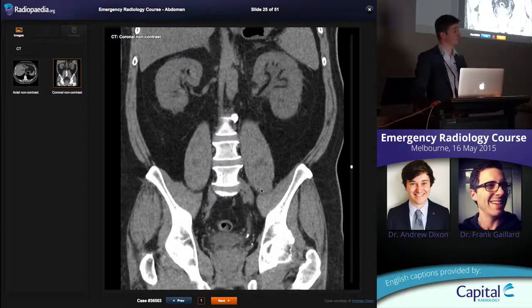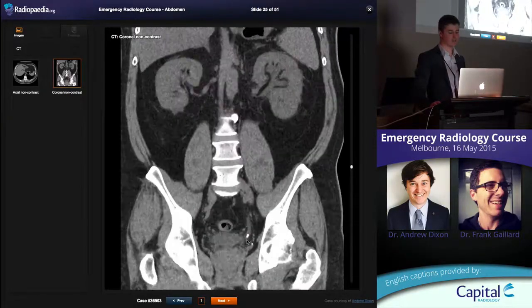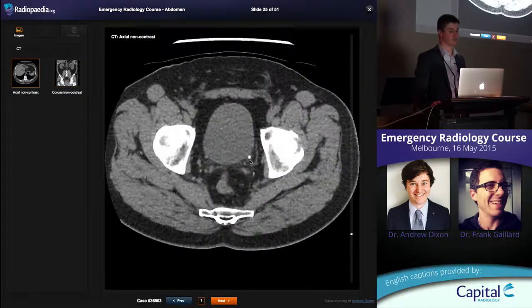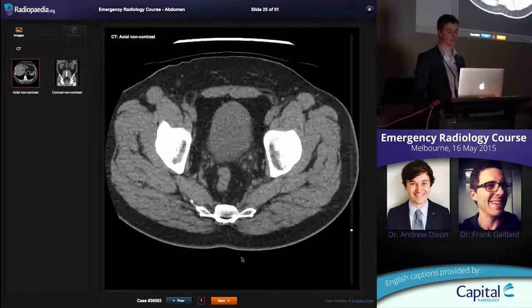Okay, is the patient septic is a very important thing. A septic obstructed picture needs an urgent nephrostomy tube stuck in. I reckon it's important to measure them in the coronal plane as well, because you often get way above 5 millimetres if you look in that plane. In the axial, you might not get to that level. I'm not sure which is the more important dimension.